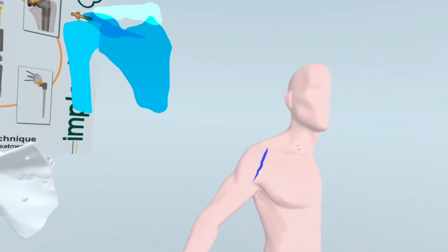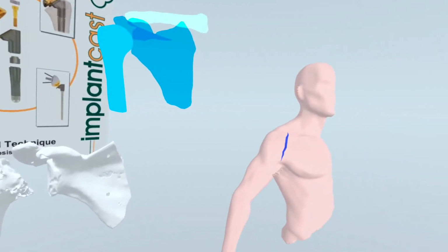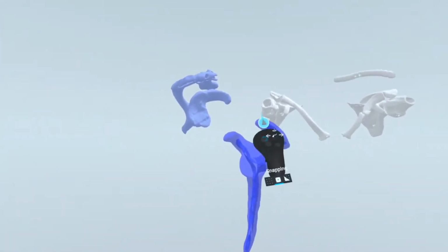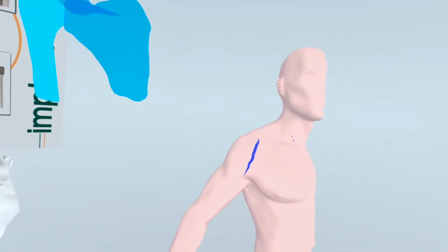This is an example of how we can use VR headsets. In this case, we are using the Meta Quest 2. Here we have some examples of files that we can use, custom files.